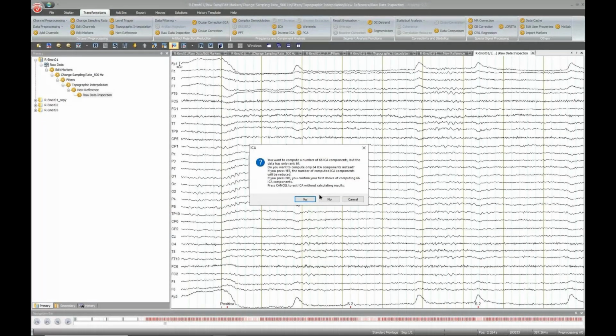So if you remember, we have the topographic interpolation, where we generated a new channel based on information from other channels. So that one channel then, as I was mentioning before, is not our original recording. Rather, it depends on the other channels. Therefore, this is detected by the sphering.